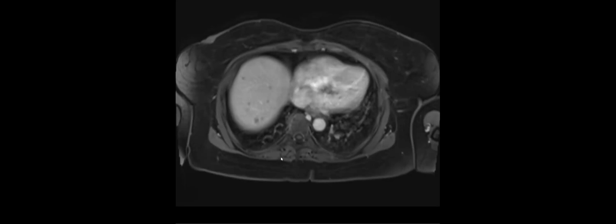When you're showing the MR, it just made me think about our protocol for staging workup, and it seems excessive to get a CT, then an MR, with a superimposed PET MR, for every new pancreatic adeno diagnosis. Staging, yeah. Wow. Like locally advanced. I remember we were starting to do them, but then it fell off, and I don't know if it was because of reimbursement or what, but we kind of stopped doing them.